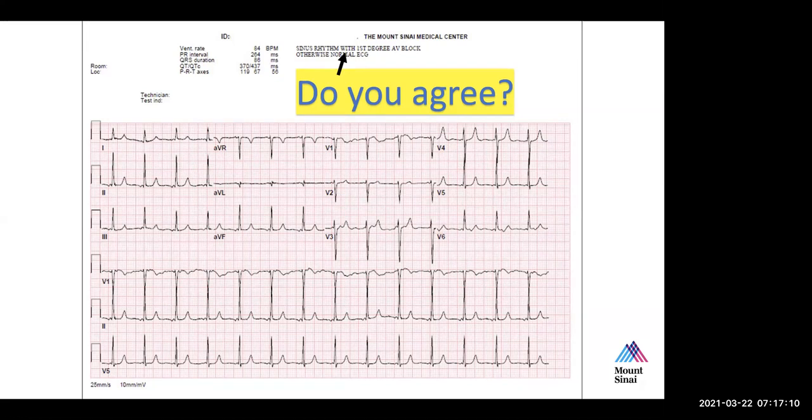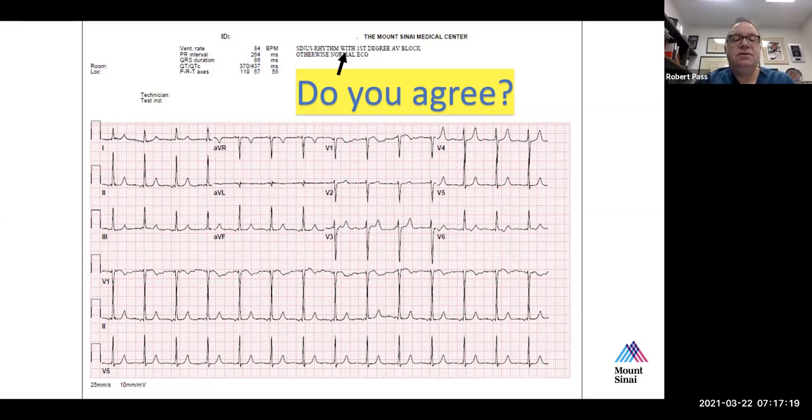Oh, that's a good question. So if I look at the P wave, in AVF, the P is actually down. So this is not sinus rhythm. Right. So this is what we would refer to as a low atrial rhythm, because it's negative in the inferior leads. So presumably it is coming from the inferior portion of the right atrium and moving in the opposite direction.